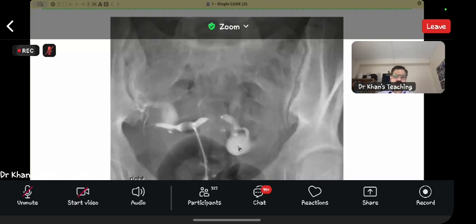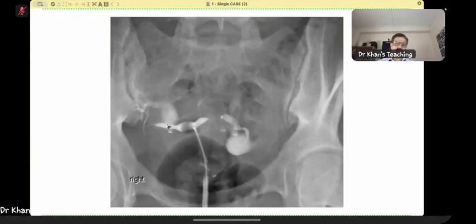hysterosalpingogram on which you can see, actually the arcuate uterus you can also suggest here, isn't it? But you can see the tube and you can see the hydrosalpinx part. There is no spillage here and there is no spillage here. Many of you might not have seen or done a hystero, but please remember they still come in the exam, and they do them in clinical practice also. Remember that. Okay, candidate one, well done.